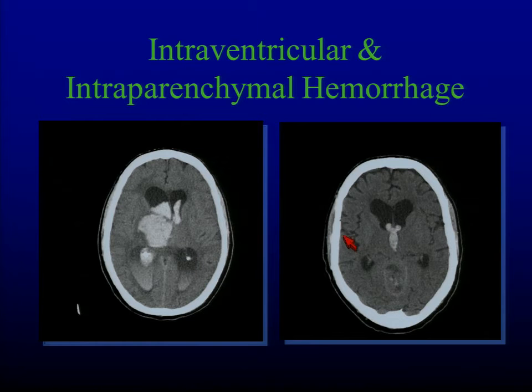The only thing I need to know, again, is if I have blood in this third ventricle, so you see a nice example here. This is somebody who's bled into their third ventricle, and there's that intraventricular foramen of Monroe there and there. The one thing I know for sure is if this patient is going to live, if they have a salvageable exam and somebody's going to do something, the very first something I need done is to get somebody who does ventriculostomies to put a ventriculostomy on this side and a ventriculostomy on this side, because CSF will not be able to get out of these lateral ventricles, and it's going to accumulate 1/2 to 1 cc a minute. And so if they are salvageable, my number one job, besides telling the neurosurgeon I got someone with blood in their head, is, I need you to come put a ventriculostomy in this patient because they cannot drain their CSF.